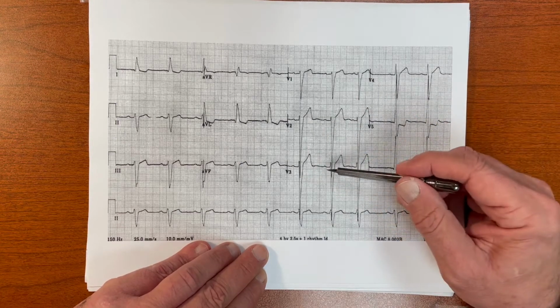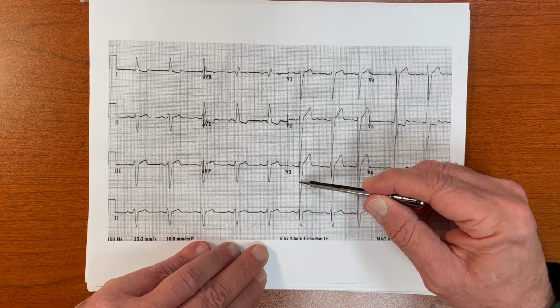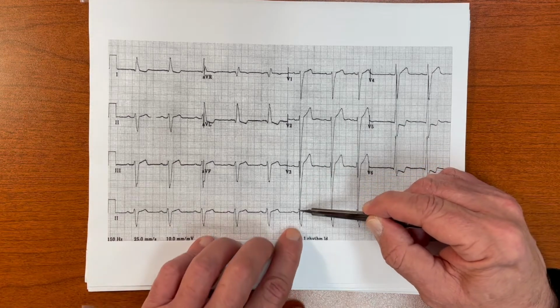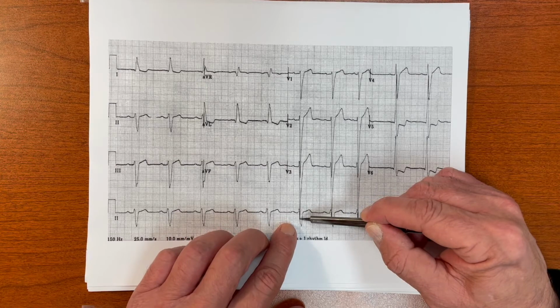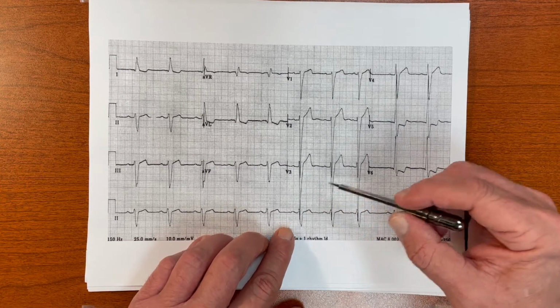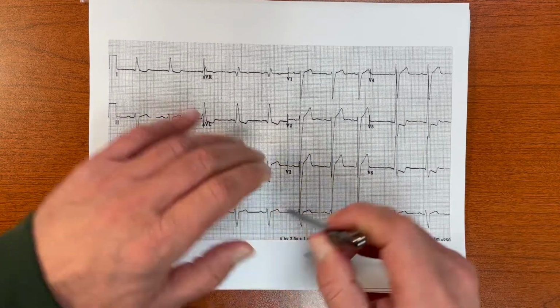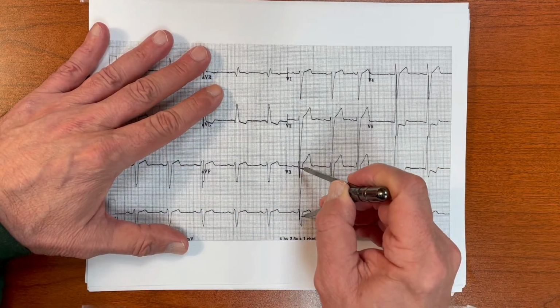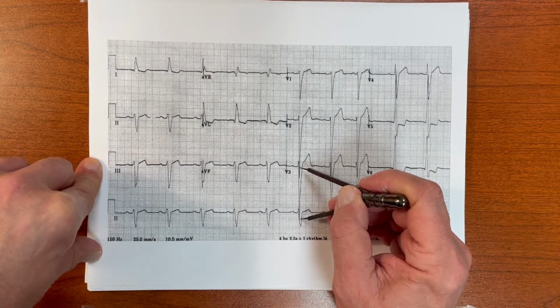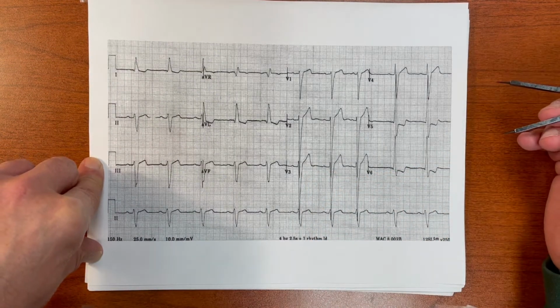So here, same thing. Let's follow it down, iso-dense, iso-dense. All of a sudden now, it's double dense because it's on the S wave, then it becomes iso-dense again. Where it stops, it's no longer superimposed. So I'll show you where that is. That's a good question though. And if you want to, this would be an opportunity to change calibration. All right.